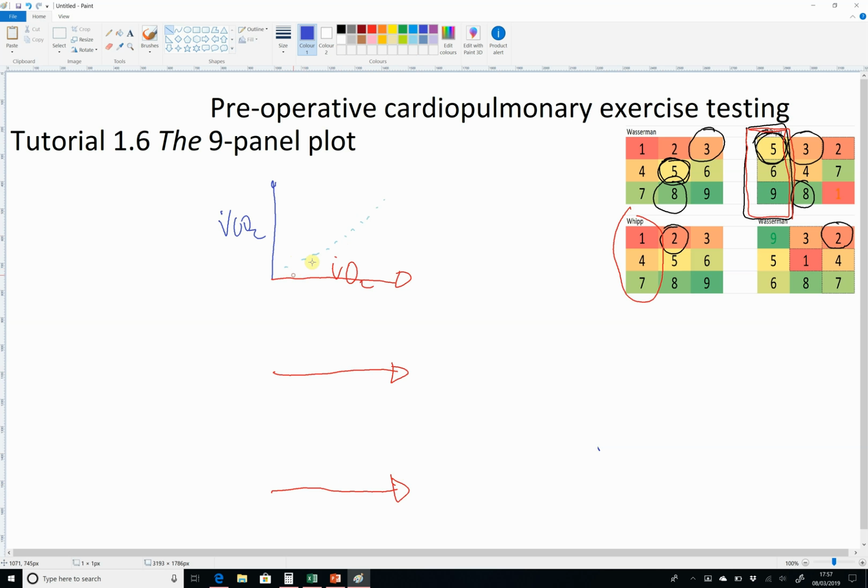And hopefully you'll recall that your other method of identifying the anaerobic threshold is a plot of oxygen consumption on the horizontal axis against two plots. One is the ventilatory equivalent for carbon dioxide, and the other is the ventilatory equivalent for oxygen. And you'll recall that during the bicycle ride both come down as gas exchange improves, with the ventilatory equivalent for oxygen coming down to a nadir at about the anaerobic threshold and then going up again. So these should be coincident. So I'm going to draw a vertical line down.